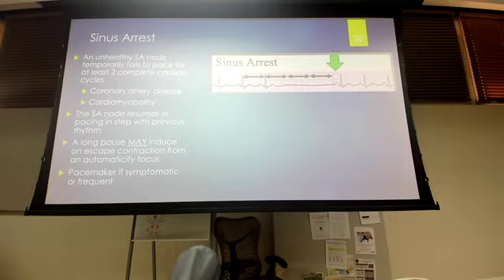So for this, we should have a cardiac cycle here. We should have a cardiac cycle here. So we're missing 2. We don't. But then this next cardiac cycle comes right in rhythm like it's supposed to. So we're missing 1. We're missing 2. It's not just a little bit late, but it comes right in the next cardiac cycle. So it'll march out, but we're missing this middle piece.